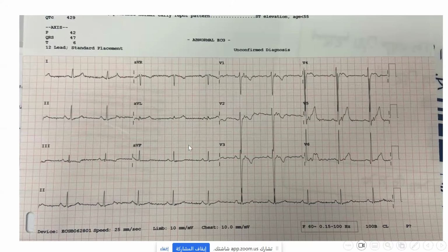Dr. Saleh, in the ECG, if you look at the rhythm strip and the shape of the P wave, could it be wandering atrial pacemaker with this different shape? Usually yes. I know someone will mention why the P wave is like this, why it's not beautifully rounded, one shape P wave. But if you look carefully at the rhythm strip, there is a lot of artifact. Look at the aVF, it's a beautiful P wave. Two consecutive P waves, it's beautiful, nothing abnormal.